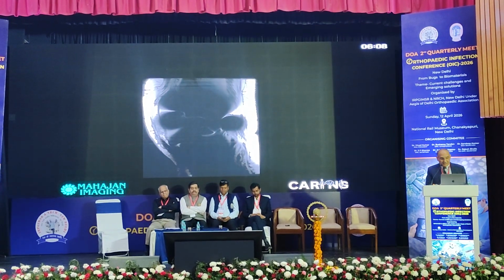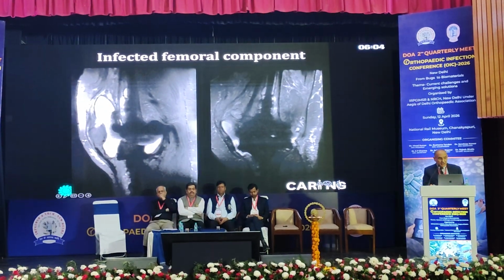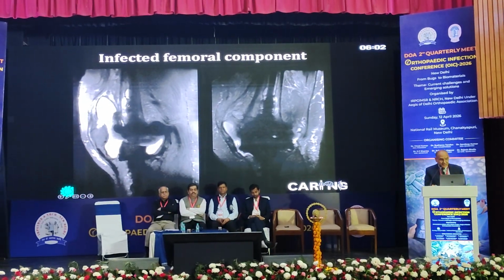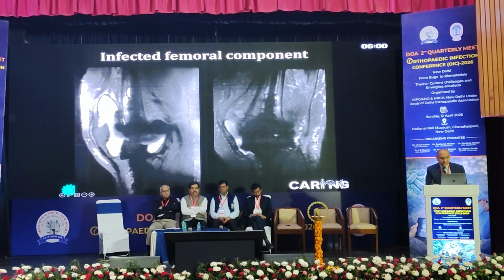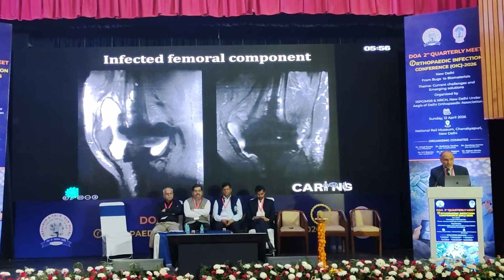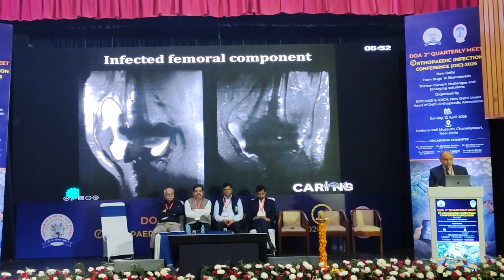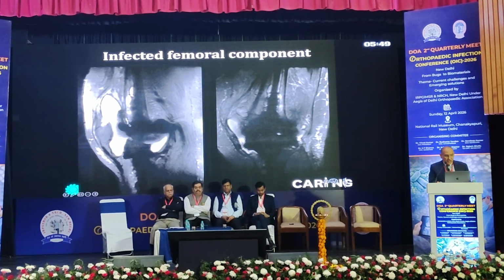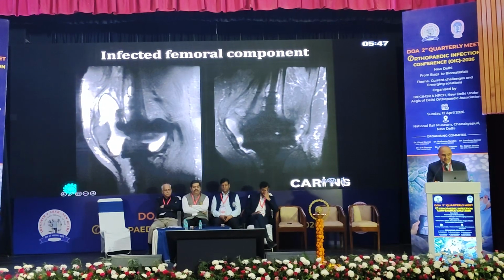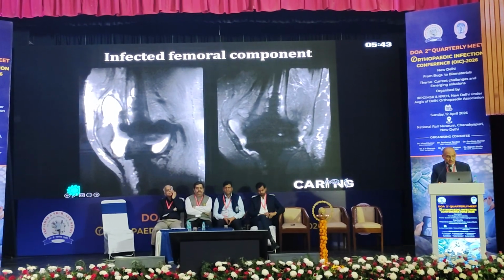This is what a standard MARS sequence showed, and this is MAVRIC, where you can see that there is this hyperintensity that we see adjacent to the femoral component. So there's infection here. Of course, we see a lot of effusion, and this was also pus. But with this, there is no choice but to go in for a further re-revision.